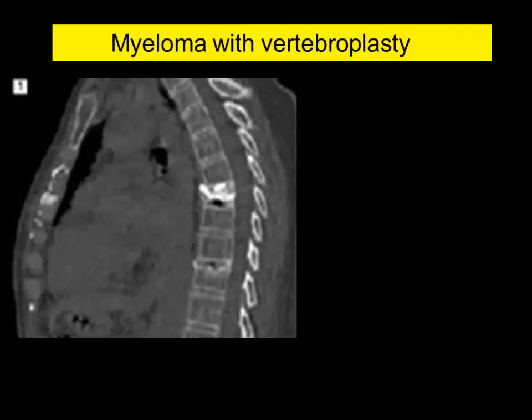This is a patient with multiple myeloma, and this patient had probably a fracture, complete collapse of this, and had the vertebroplasty for this, and the pain was still there. So as Gopi said yesterday, if you have a spine with multiple fractures, you need to find out which one is acute, which one is subacute, and which one is chronic. So if it is acute, then probably that is the pain generator. So it is very difficult. MR can at times tell you whether these are acute changes because of bone edema.